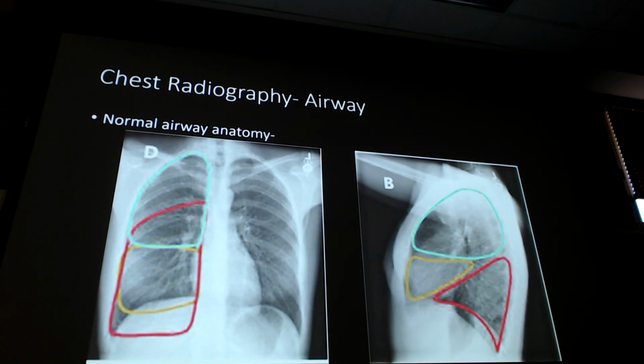Also why the hemidiaphragm is going to be lower is because we got this section that's lower. Sure, it could still be middle, but again, it's an educated guess based off of the silhouette sign. We're going to go with lower if it's the hemidiaphragm. You can see now too why we do the upper lobe for any of the thoracic or ascending aorta area. It's really the only thing that's kind of in that area. Again, in the absence of a lateral film. If you have a lateral film, you don't use silhouette sign, you use the lobe to figure out exactly where it's at.